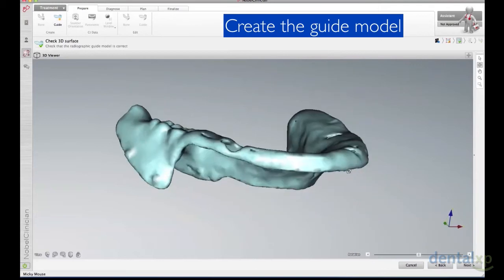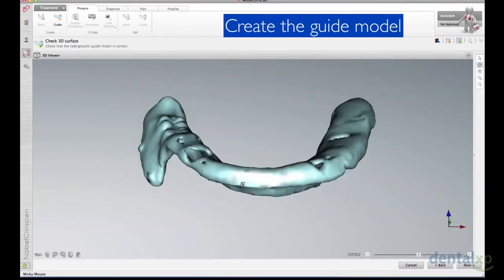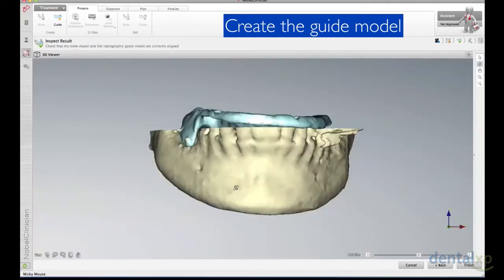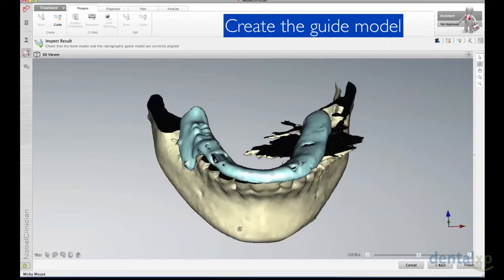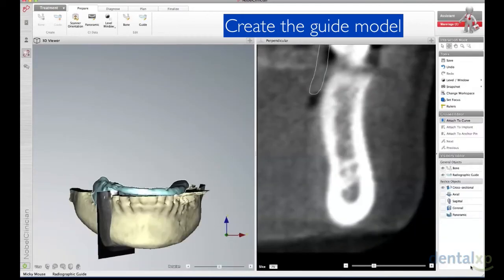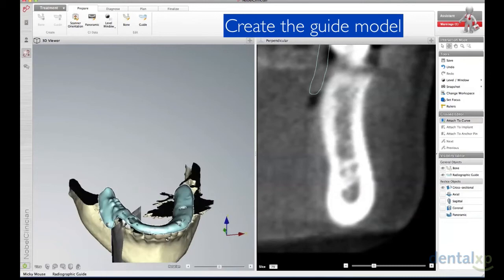Once we've captured this, we can see where our two tooth forms are, where we want to have them from the diagnostic wax-up. We will then be able to superimpose the data based upon those fiducial markers, as we have seen here. Although we have the cropped teeth, that information is still present in the radiographic data, and we can look at the template and position of teeth that we want to see.